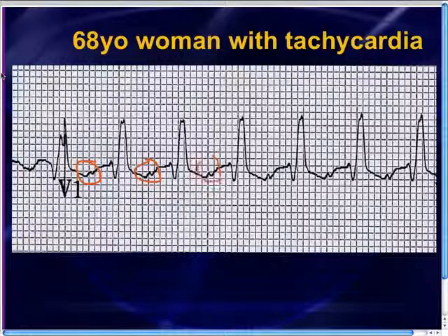There's little P waves that are kind of halfway between the QRS complexes. So this does actually help a little bit with our differential. With ventricular tachycardia, you can sometimes get P waves, but they don't tend to be regularly associated with the QRS complexes. In other words, those PR intervals tend to be changing. That's the classic AV dissociation that we've learned to think about with ventricular tachycardia. In this particular case, the PQRS complexes are very clearly regular, and there's kind of a long PR interval.